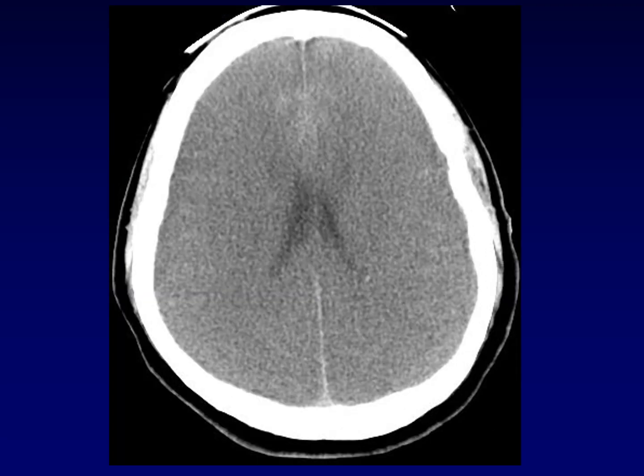This next CT scan is sort of a pop quiz. I want you to think about this image and see if you can figure out what's wrong. This is a 78-year-old guy who came to the emergency department because he wasn't responding to his family. So go ahead and pause the video right now and think about what you think is wrong with this image.